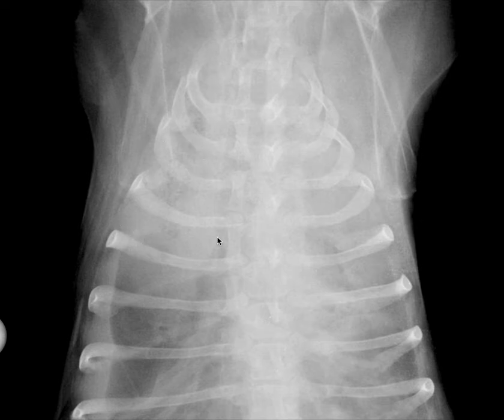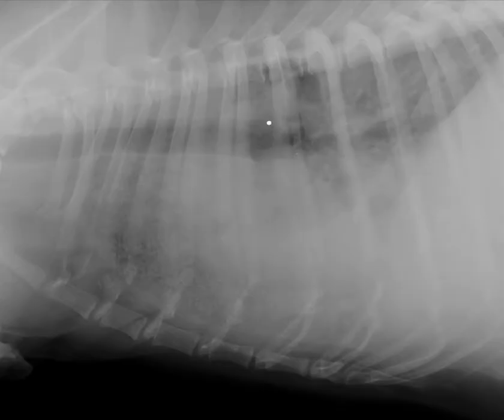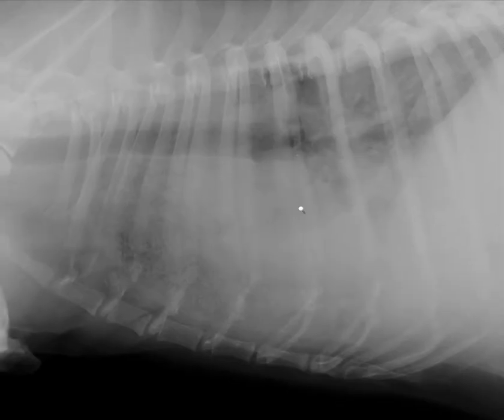Virtually all the papers on lung lobe torsion, which I've listed for you in the report, do mention this pattern along with pleural fluid. The site of lung lobe torsion can vary a little bit. There are trends towards larger dogs having this more likely in the right middle lung lobe. Some smaller dogs may have this in the left cranial lung. There are, in terms of the interstitial pattern, reasons for this dog to have hypoinflation atelectasis because of the pleural fluid.